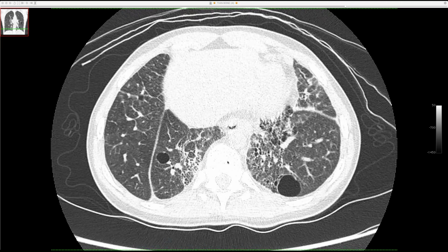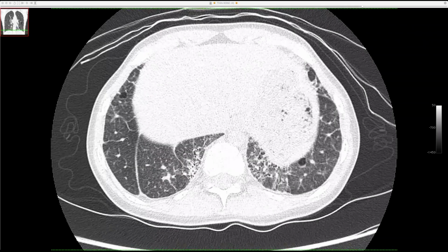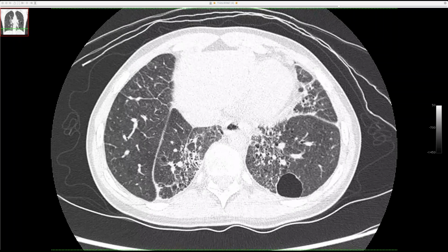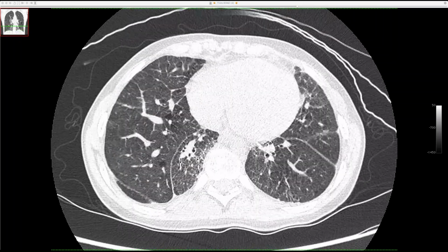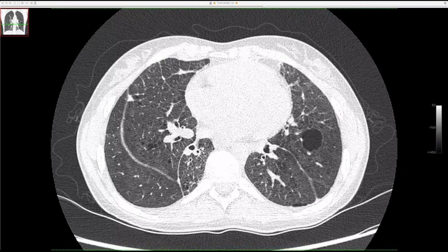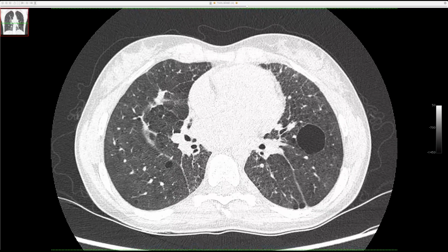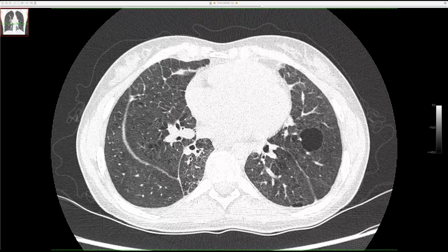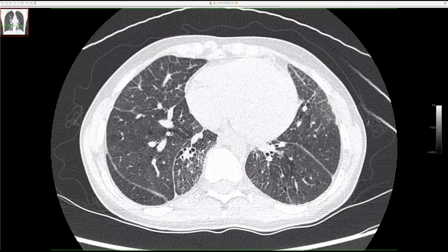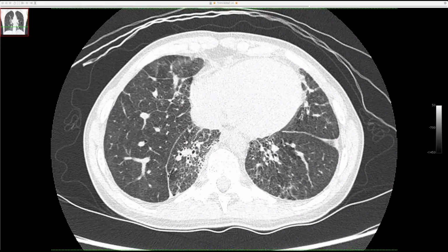And then if you scroll around, I think I may have seen septal lines. Oh, yes, she has the fissure, and I don't know what's going on with that, if that's related to anything, if there's just pleural fibrosis, because a lot of times they get multi-compartmental disease, and there's some pleural fibrosis that we can't see that's causing redistribution of lymphatics. Yeah, it's almost like her lungs could be a little bit wet on top of everything.